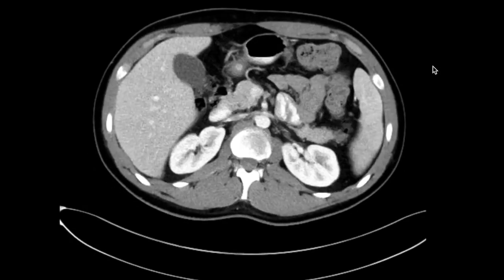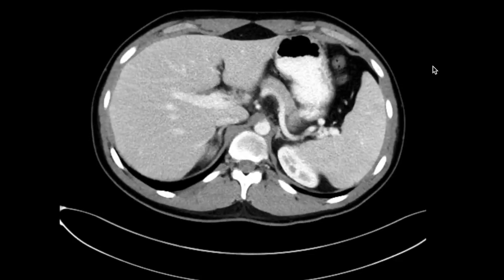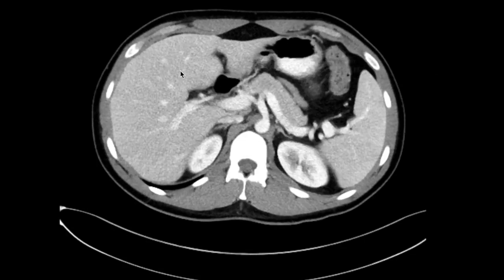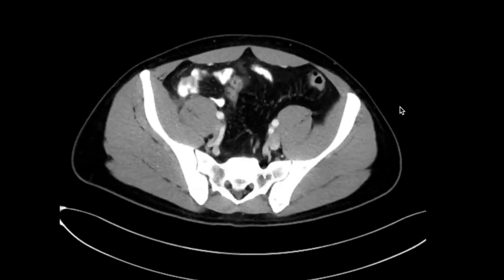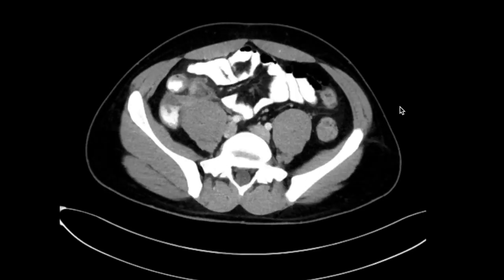And second of all, if you see something that's absolutely emergent, you want to look at it more closely and call the referring clinician. The other thing is that when you're so focused on looking at very small areas of the scan, and you look at the liver and the spleen and the kidneys, etc., you really get tunnel vision looking at those specific organs, and you miss the big picture and often can miss findings even when you're so zoned in. So I always start with a scroll down and a scroll up looking for obvious abnormalities.